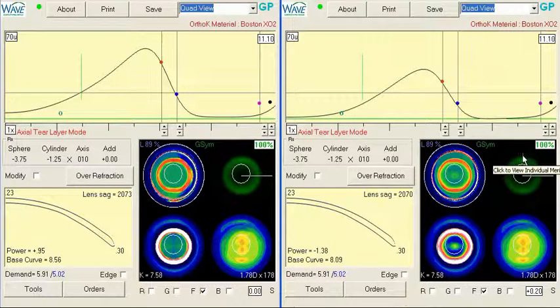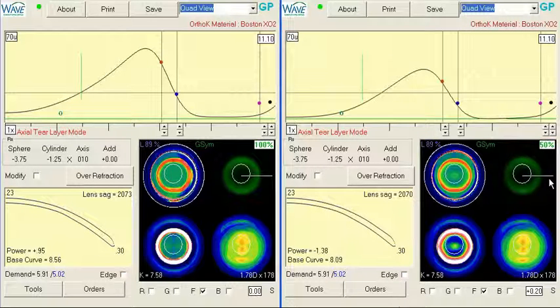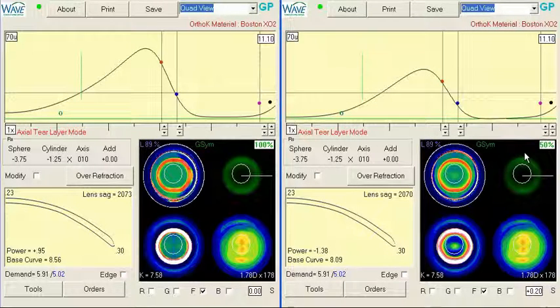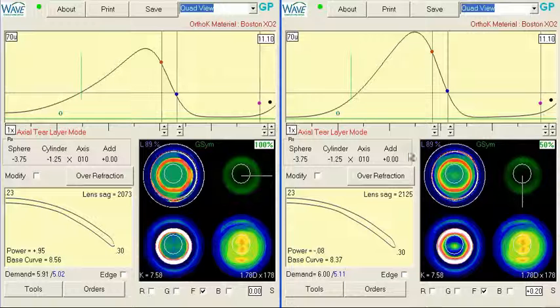Let's make sure we still have the diopter and a half here. And let's see, 138 to 6 is 144, so we're pretty close. If we want, we can always bump this a little bit more. Nope, got the powers mixed up there. So that should be a plus 12 approximately. So we want to bump this one a little bit.